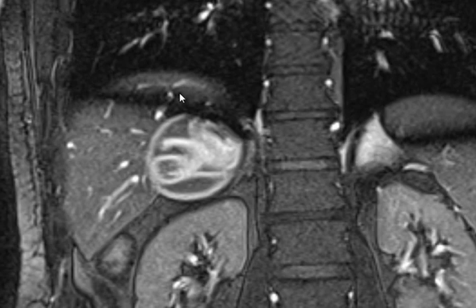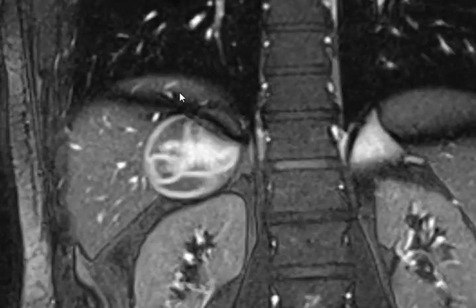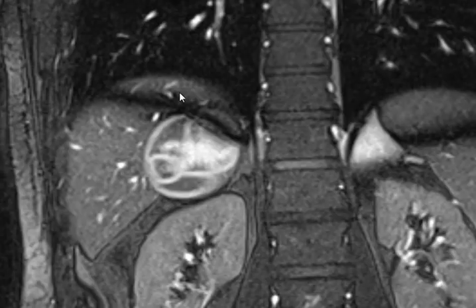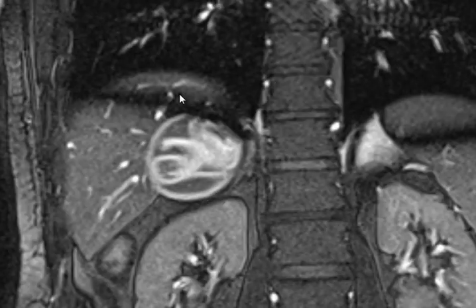It looks like from outside the liver. Even the surrounding is less than 50% liver. If you look carefully, it's less than 50% surrounded by the liver. So if it's from outside the liver, from where? Suprarenal. This is an adrenal gland hydatid cyst.